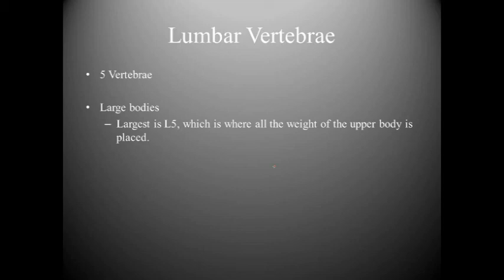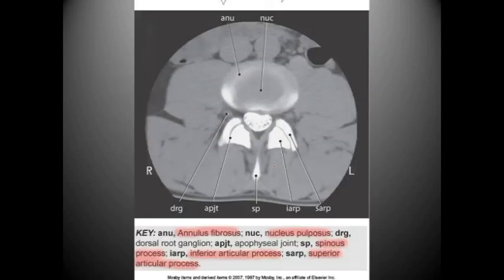And so if you're overweight, then you have a lot more weight actually bearing down on this joint, and so it's wearing out this disc space to a higher degree. And so typically L5 is where you're going to see a lot of abnormalities. That's not to say that there aren't abnormalities that go well above L5, but L5 is a very common place to see abnormalities. So we're looking here, and we see that we have contrast inside of this area.